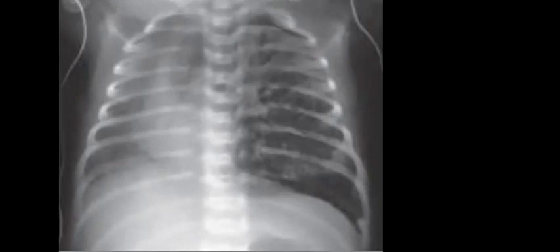In the image, if you want to check if this patient is premature or not, try to find any key signs. As you check for the humeri, the humeral heads, if they are ossified or not. So absence of ossification could suggest to you that this patient is premature. And also if there is reduced subcutaneous fat, it is going to be with the premature.